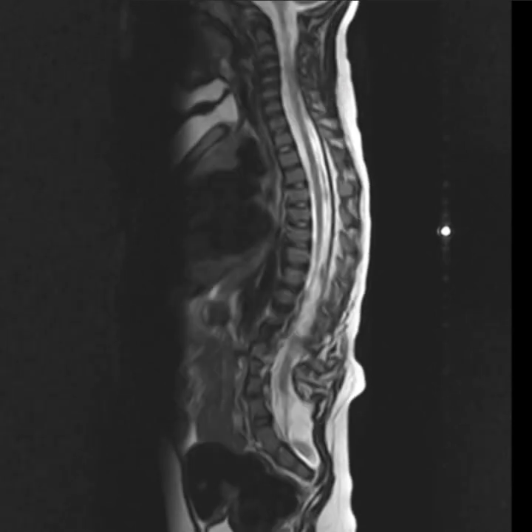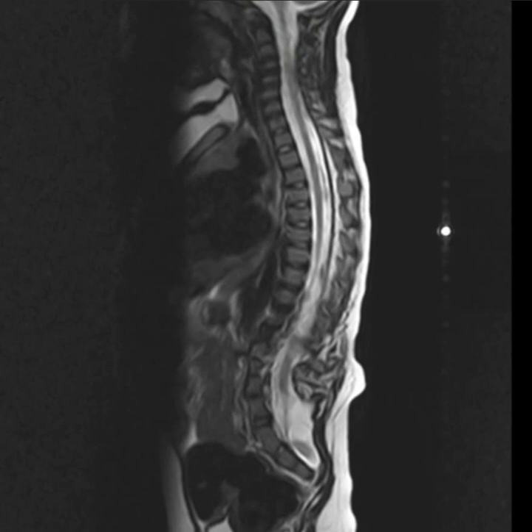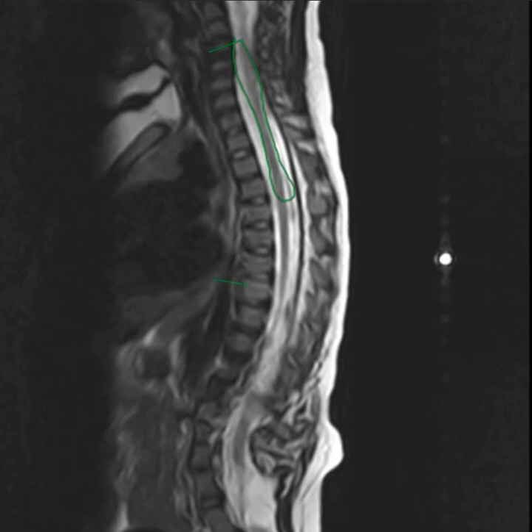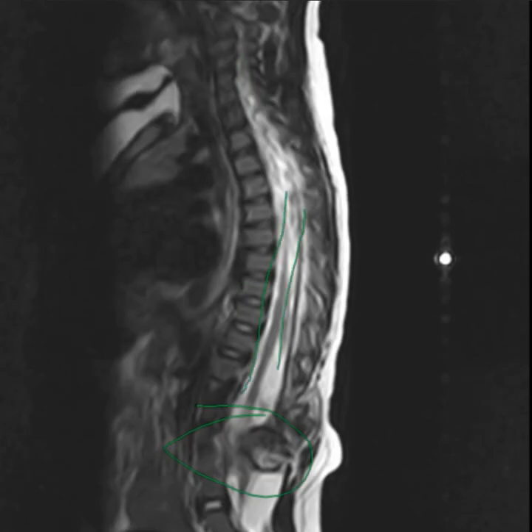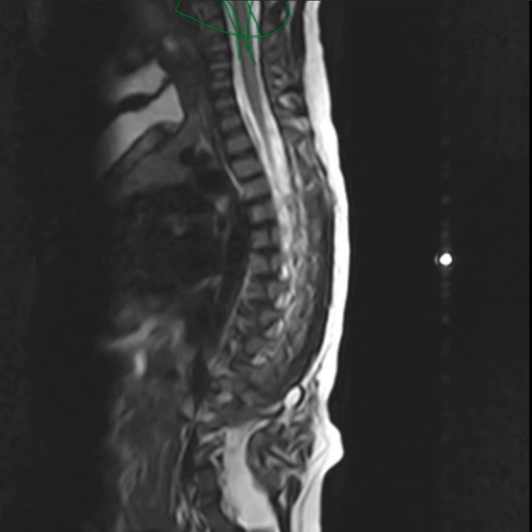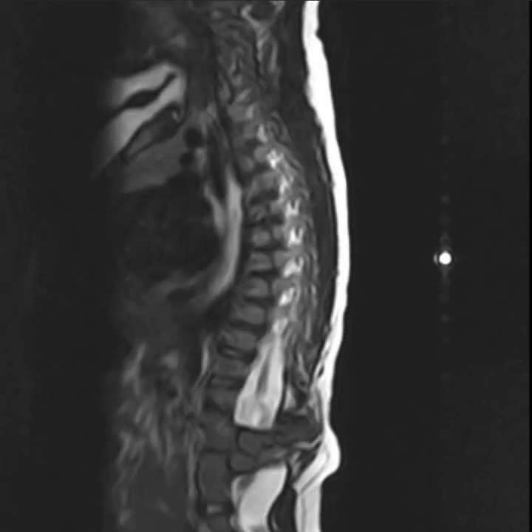And the second thing, you need to not focus only on the main pathology, which is the bony spur and the diastematomyelia, as we discussed before, but also look at the rest of the spinal cord. For example, here, look, is there any sign of syringomyelia, for example, any other tumor or cyst or whatever? So you need to comment. Of course, here there is nothing, so you need to comment on the craniocervical junction, the spinal cord at the cervical level, and the rest of the spinal cord if there is any syrinx or any other pathology.